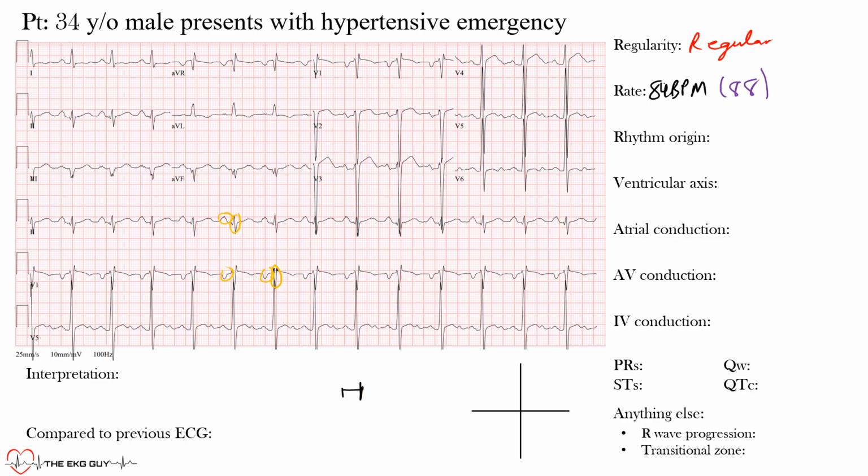And what do I mean by supraventricular source? I mean that it's originating from above the ventricles. So imagine this here as your heart. Okay, I'm very simple with teaching. So this is your right atrium, right ventricle, and left ventricle. Supraventricular means simply coming from above the ventricles, if you see those P waves preceding. And not only that, it's likely coming from an atrial source, from the right atrium or left atrium, or the sinus node that sits up here. And that's what we have to ask ourselves.